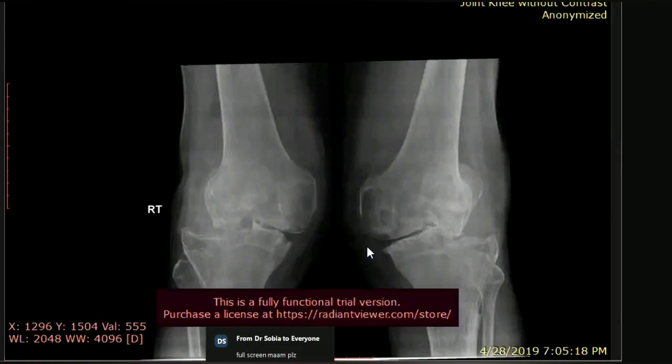In advanced osteoarthritis, you still don't see these types of changes. Instead, you will see preserved bone density and huge osteophytes, and not erosive arthritis with subluxations. So rheumatoid arthritis is a good thought, and the description needs to be further improved.